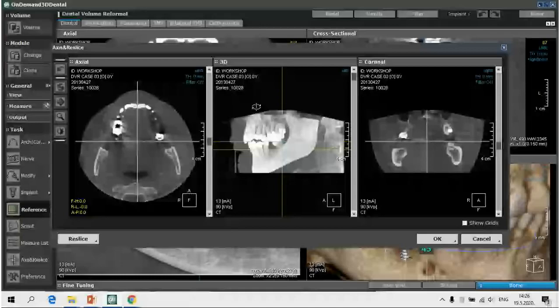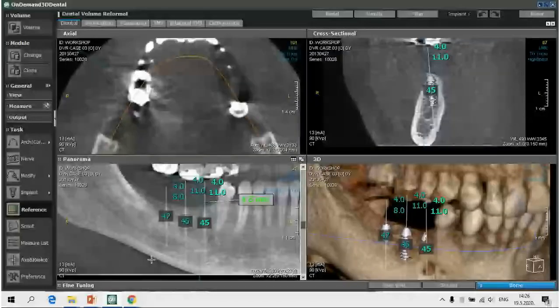This is not a big deal, because if we do not have motion artifact, which is represented by double pictures on the volume, the orientation of the patient during the acquisition is not important, and we can freely change that orientation in this part of our module.